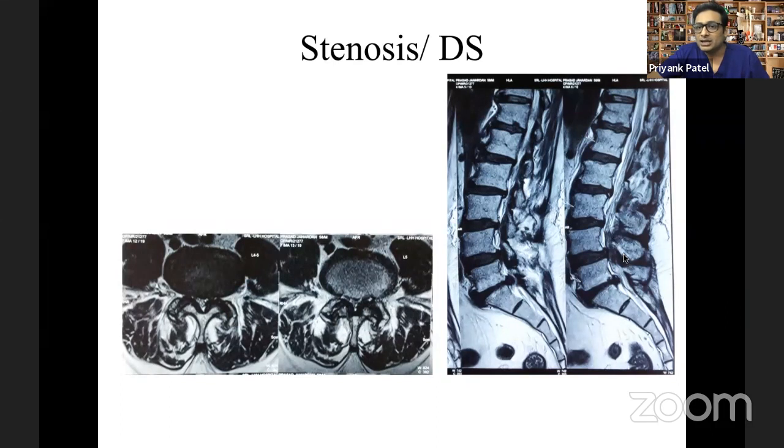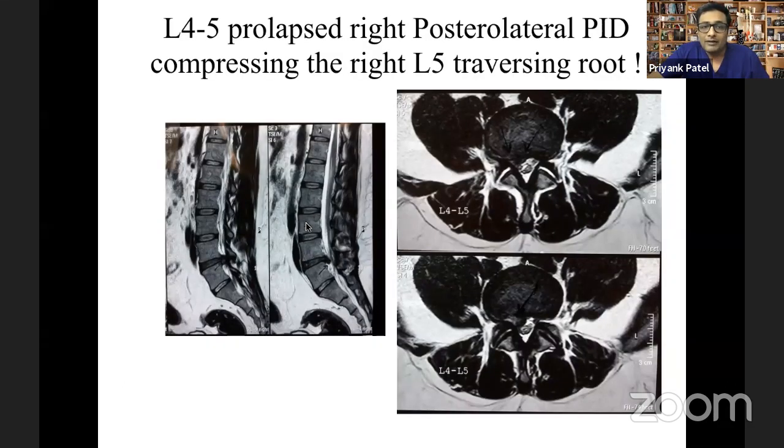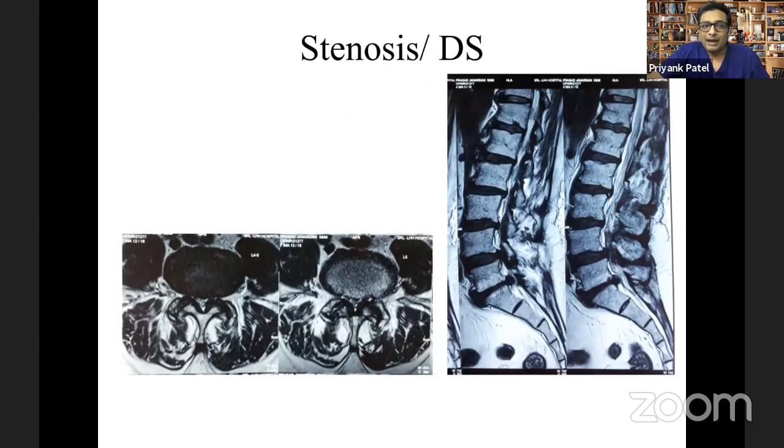You see this? In contrast, see this MRI of the disc prolapse, where everything is white, the bones are looking nice, there is white behind the cord, so fat is still intact. What happens in stenosis is there is arthritis of the facet joint and there is disc bulge. So the poor cord is getting crushed from all sides.